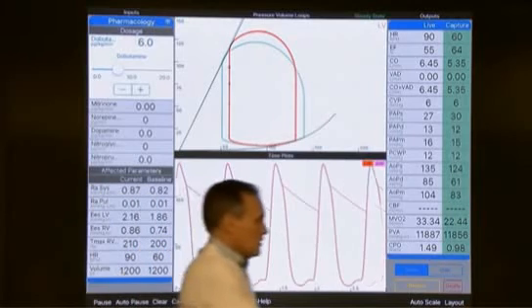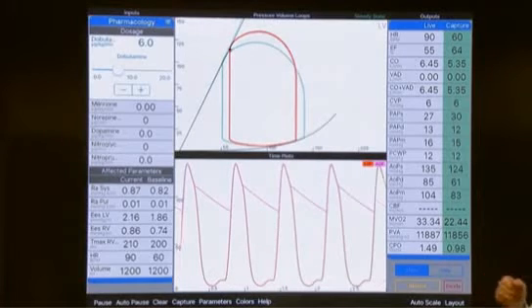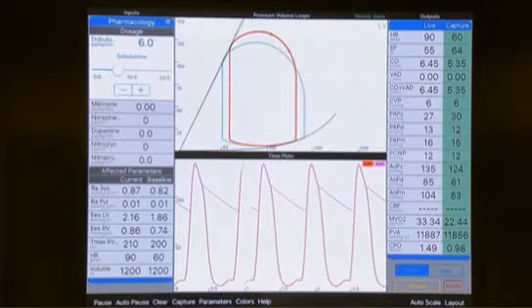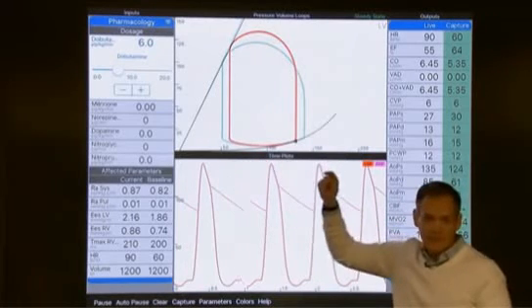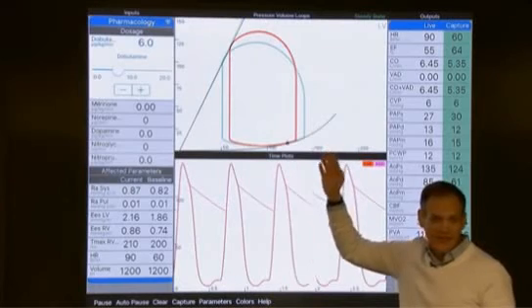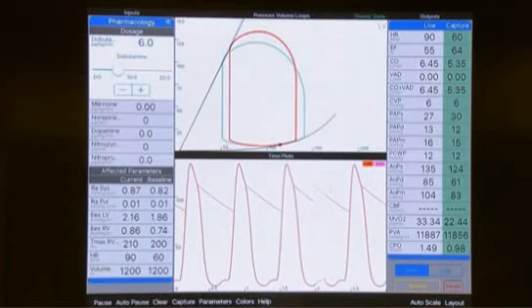So, did I achieve the goal as a physician I was trying to achieve? In part I did, right? If I was just thinking, I've got to get this patient's pressure back up, we got the contractility back up. Did the pressure go up? Yeah. Went up even higher than we started, right? But it went up higher than we started because of that heart rate effect, right? There's an inherent heart rate effect.